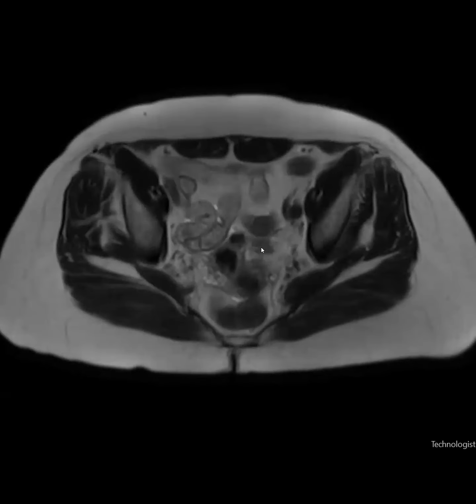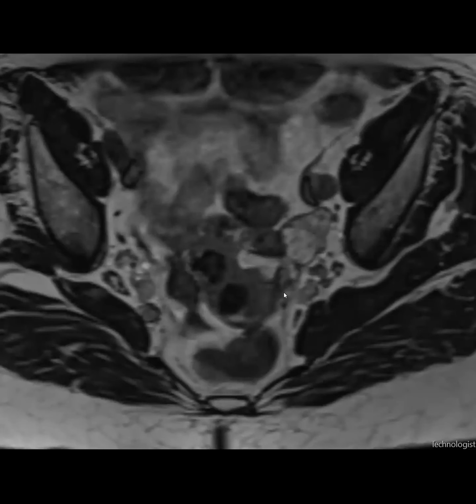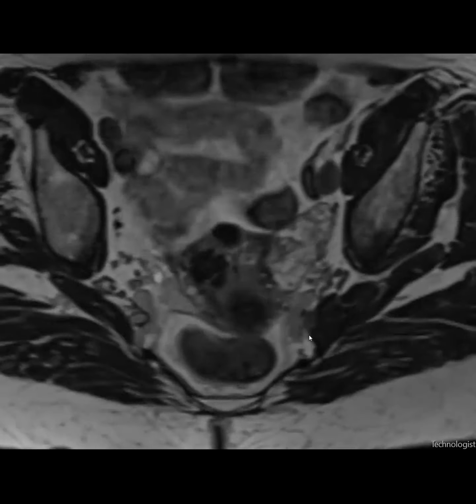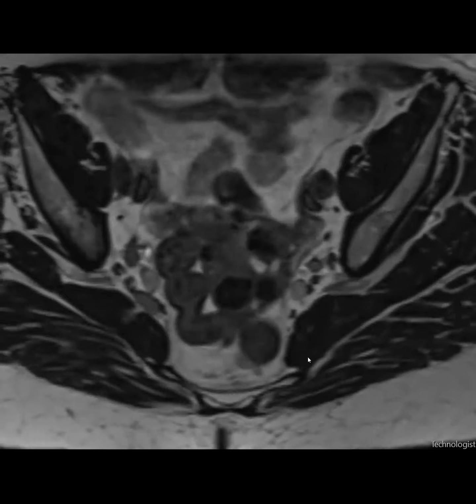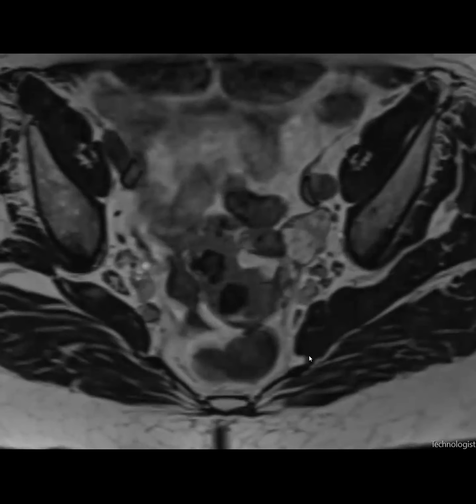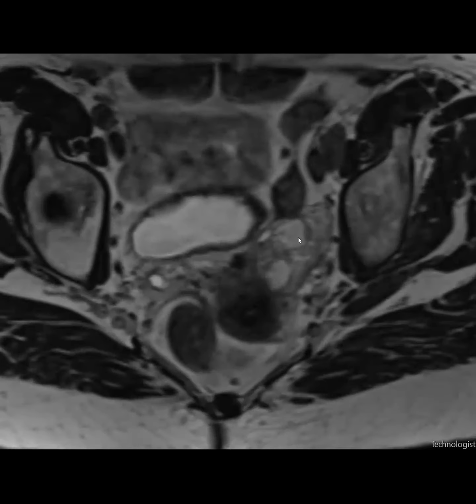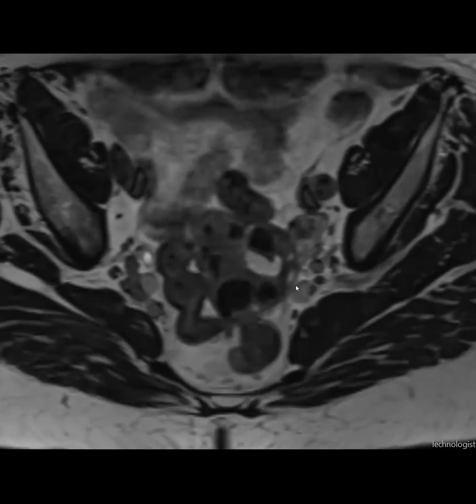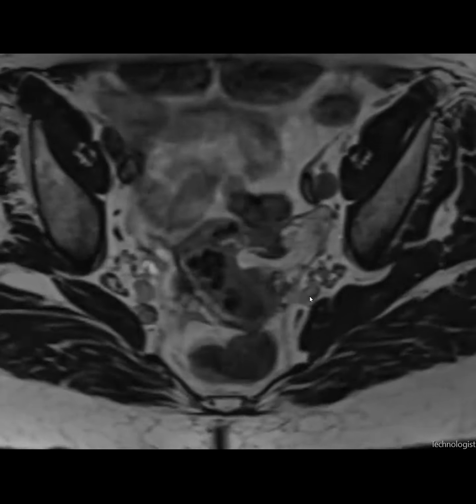And I'll just tell you that this was the lesion. I'll show you the high res too. So this is the high res. It's not like a clean fat. It's like a weird. And does it sat out like fat sat? Like, does it sat out? So is it really fat or is it like a myxoid lesion that's T2 hyperintense?